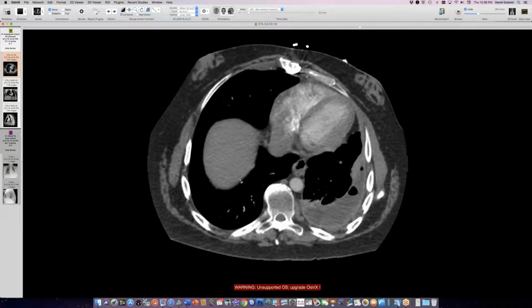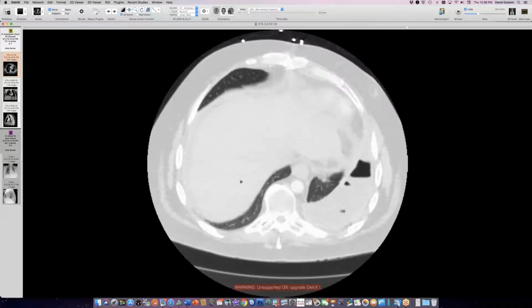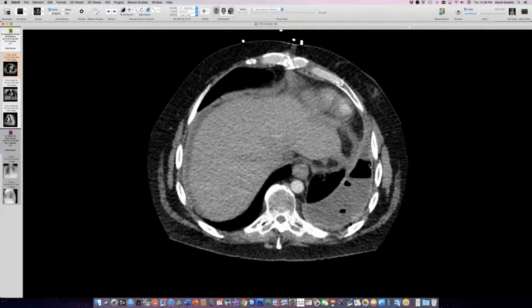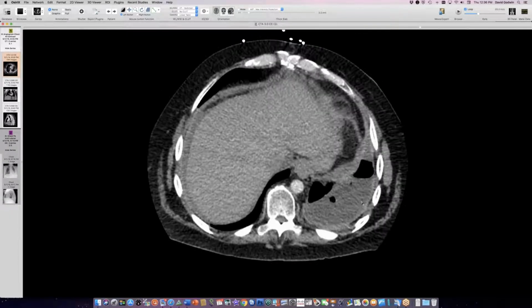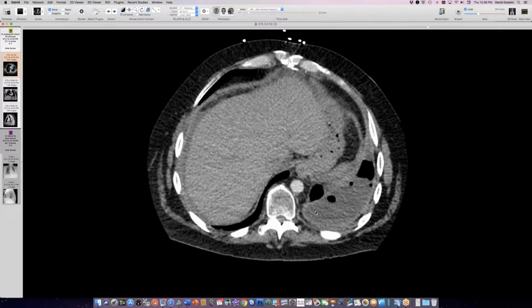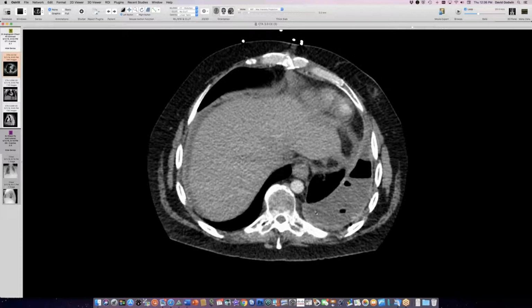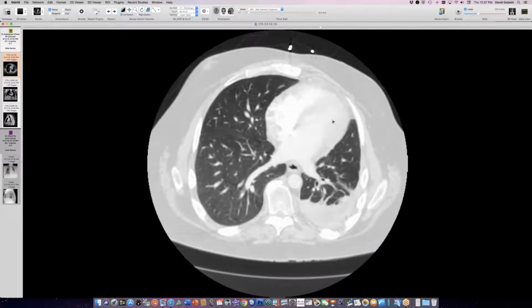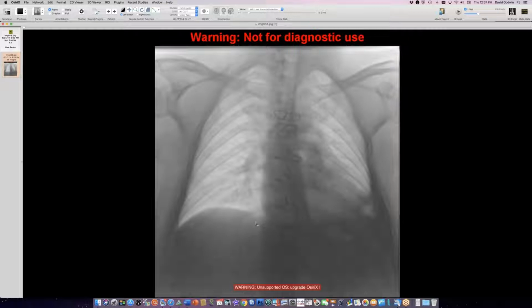And this is after one of his recent surgeries. So at this point, he still has a pneumo component, not just a pleural effusion back here. And he does have pleural thickening too. You can see that there's a white stripe on both sides of the fluid collection. So hydropneumothorax here after a pericardial window placement and drains being in place and all of that sort of thing. But he's a little short of breath, and so they asked me to do a diaphragm fluoro on him.